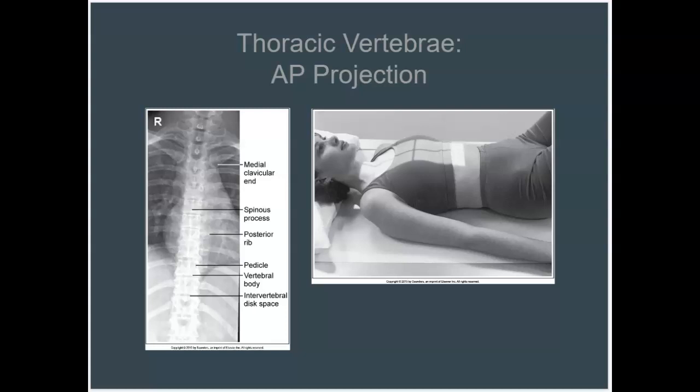The 7th cervical vertebra, 1st through 12th thoracic vertebra, 1st lumbar vertebra, and 2.5 inches of the posterior ribs and mediastinum on each side of the vertebral column are included within the collimated field. We should transversely collimate to about 8 inches field of view, utilizing a lengthwise field of view of 17.